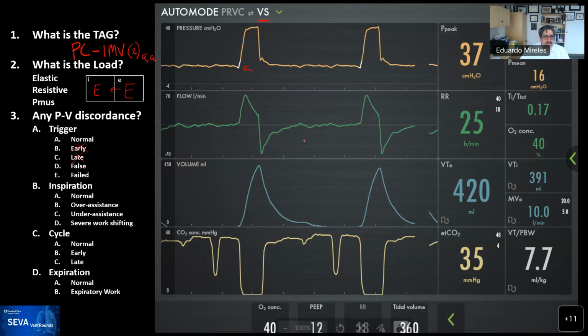However, when you come down and look at the capnogram, you see inspiration occurring, and it goes to phase 1, so there's nothing. And then phase 2 occurs rapidly. It rises really rapidly as exhalation is happening.